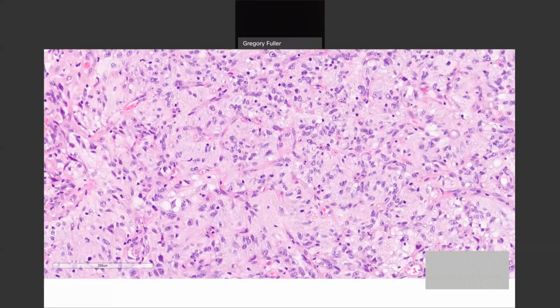All right, let's put this together if we can. So it's a big cystic lesion, fairly circumscribed, with surrounding modest vasogenic edema. And the features of the lesion itself are that there are areas that look oligo, with round regular nuclei with halos. There were little calcifications in other areas. I will tell you that, I did not show them. In some areas, it's a more spindle morphology. That's another feature. And then the endocrinoid vasculature, that's one. And the perivascular pseudorosetting. So those are all the pieces.